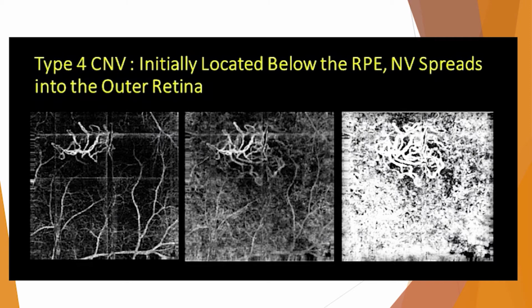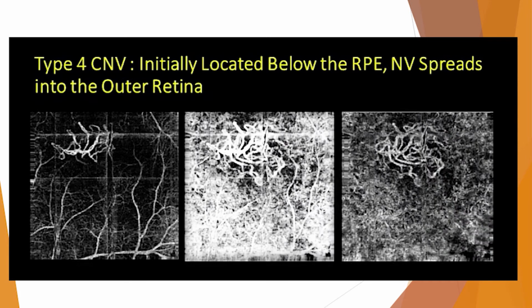What happens, though, if you were to take your slab and you started to move it little by little more anterior, okay? We're not going choriocapillaris to deep retina. What if we just went little by little, we're coursing up? So the picture in the middle, you can begin to identify that there's 2 lesions. So you can begin to see that as we're getting closer now to the outer retina, the 2 membranes are becoming more apparent. Look what happens when I get to outer retina.